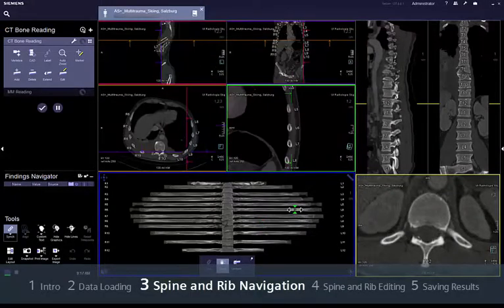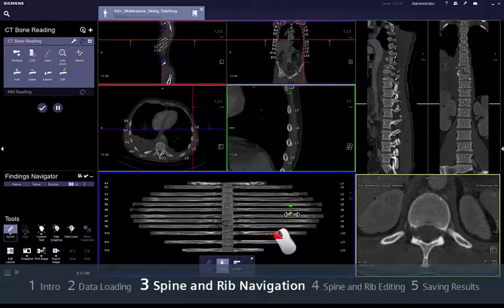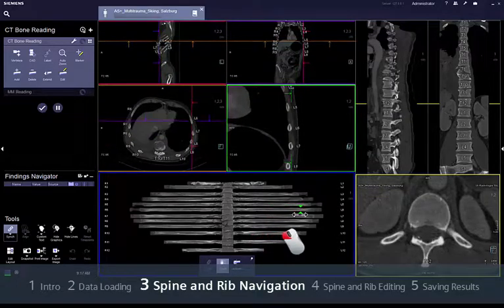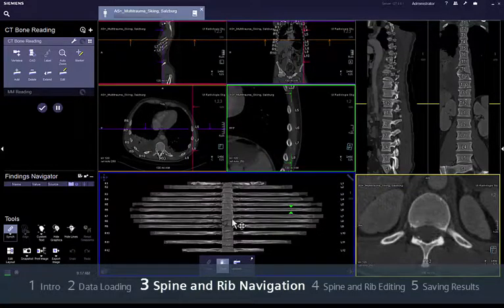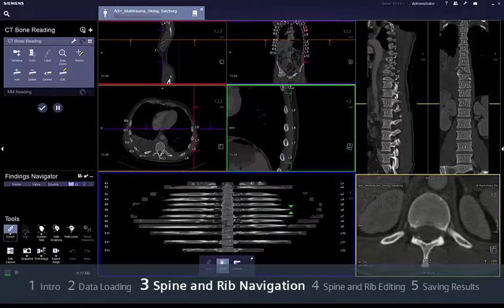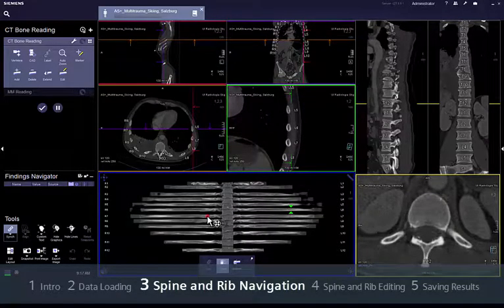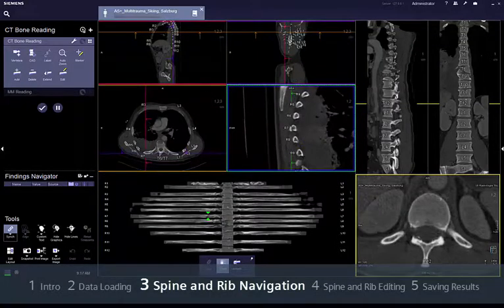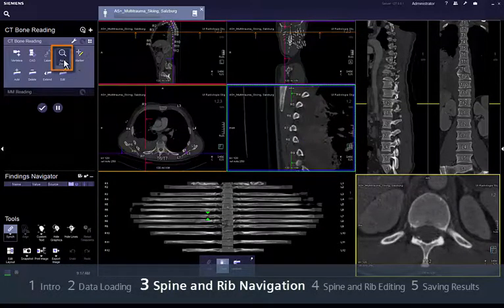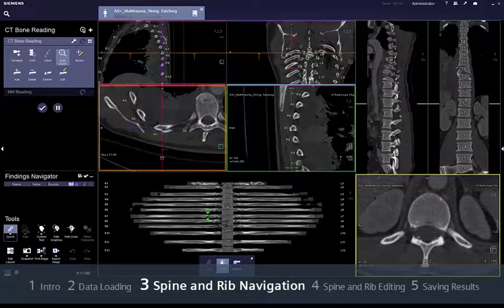By clicking or dragging with the left mouse button, you can navigate along the ribs. Notice that the cross-sectional view and the 3 MPRs navigate accordingly. The unfolded view will help you to detect any lesion easily. Then you can simply click on it to correlate with the standard MPR views. Additionally, the auto zoom function and the rib labels will help you in the interpretation and reporting.